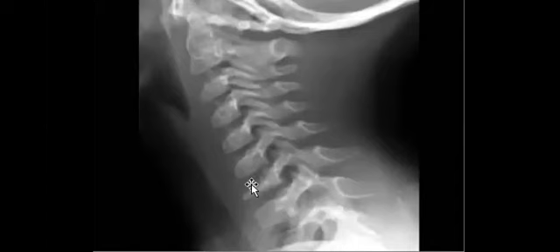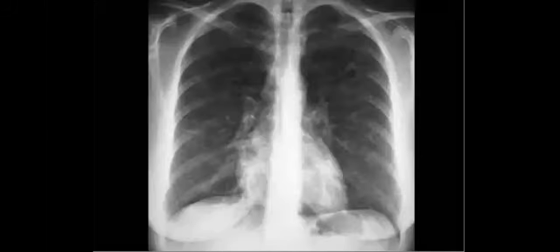then vertebra plana. Okay, they like to show you the other manifestation of Langerhans or eosinophilic granuloma with vertebra plana. The differential will be metastasis, leukemia, lymphoma, metastasis. Yeah, and infection. Don't forget infection. Yes. Lymphoma, trauma, TB. Perfect. Trauma. Yeah, it can be TB.